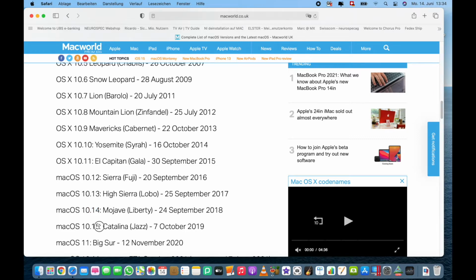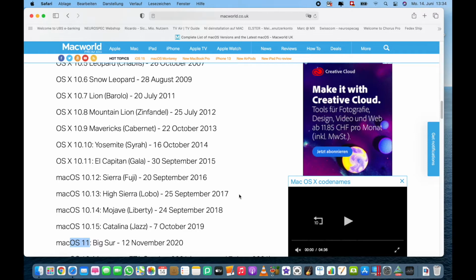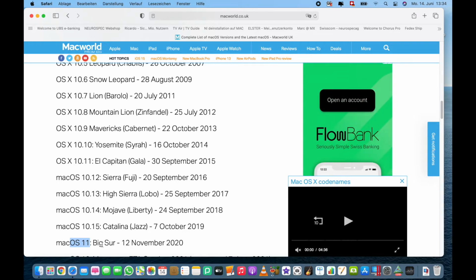However, you have probably already run into issues with Catalina and obviously now with Big Sur, which is the OS version 11. Unless you constantly upgraded from Yosemite to El Capitan to Sierra to High Sierra to Mojave and then to Catalina using the 2016 runtime engine already installed on Yosemite or El Capitan, that would move forward well. We've tried it and it actually works. Whether moving that forward to Big Sur, I am unsure because I haven't tried. I would, like I said, not suggest going that way.